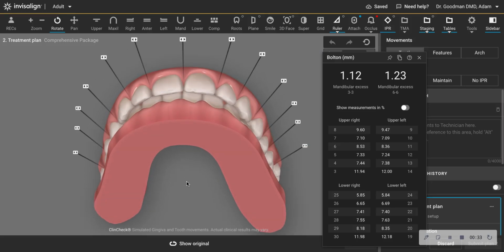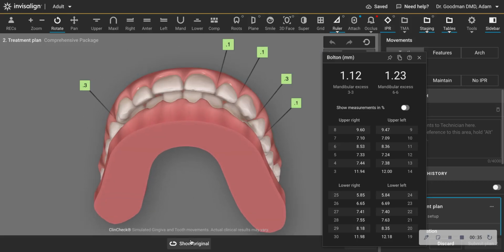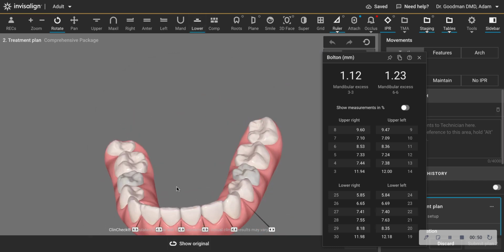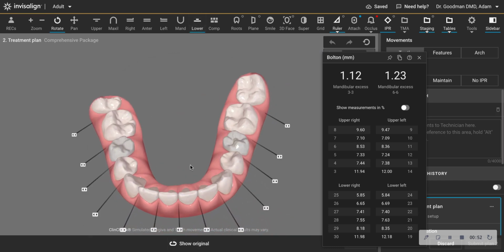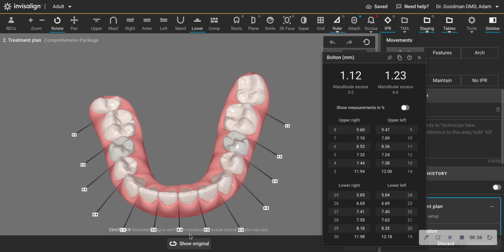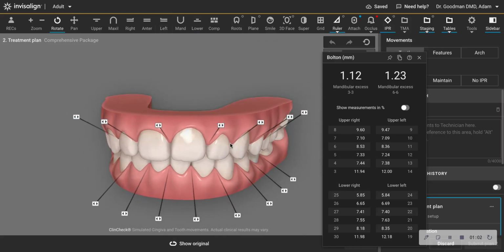Now, currently, the patient is in a pattern where the teeth look like this. This is a little bit more normal in terms of that spacing if you focus in this area. But currently, those green point ones mean the patient has some very small spaces between the teeth. And as you can also see in a moment, the lower teeth, which is the patient's chief complaint, are crowded. And as they become aligned, they move forward. That's how you find the room to make them straight without removing teeth, which was the old fashioned way.